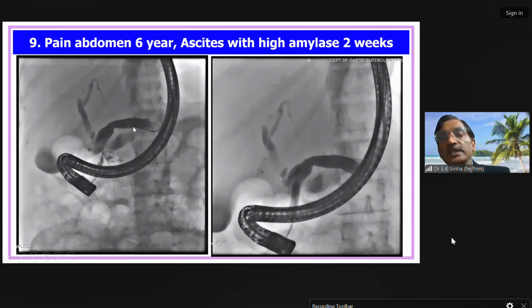Pancreatic duct diameter is 3 millimeter, 2 millimeter, 1 millimeter for head, body, tail on the MRCP and non-dilated. In ERCP, and in the elderly population, more than 65, 70 years of age, you can use 1 millimeter more, because with age, the diameter tends to increase.